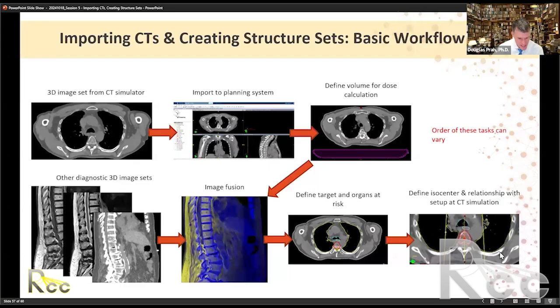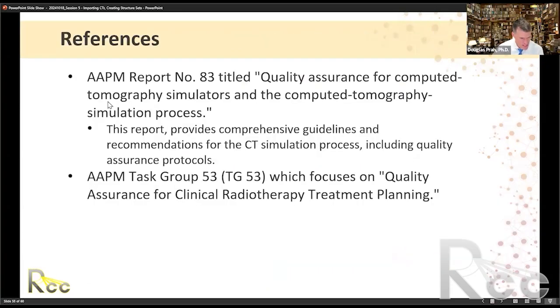I personally like to put these points on right away, even before I start contouring. So I usually do that up here when I assign the electron density and put the couch in. For me, it's just sort of basic maintenance, and it's all in the same general area in the planning system, so I get it done up front. So I wanted to put these references.